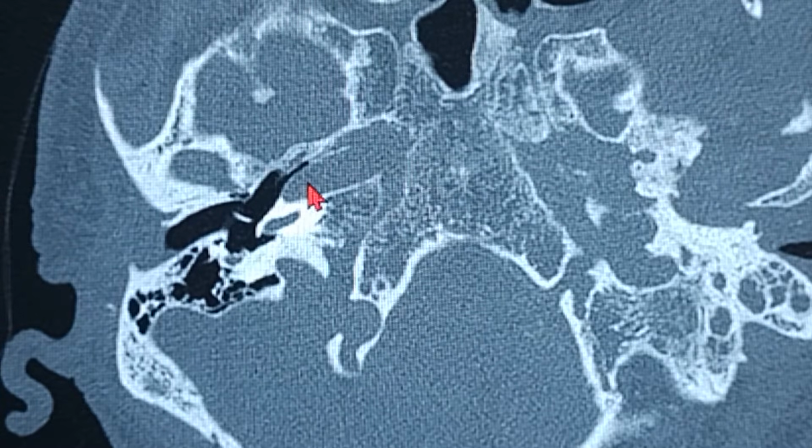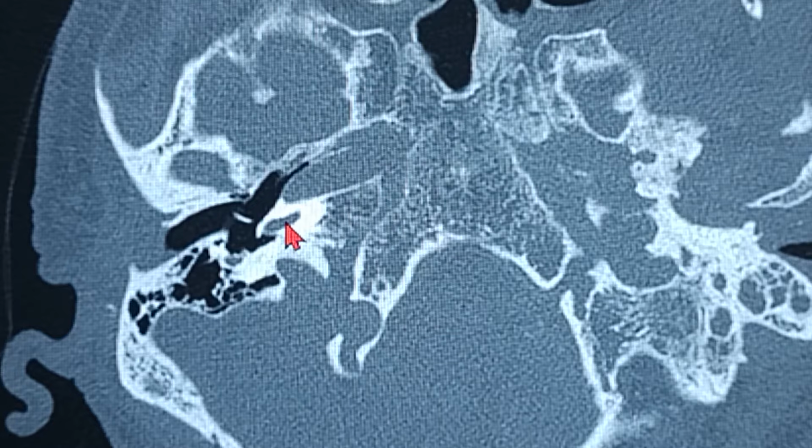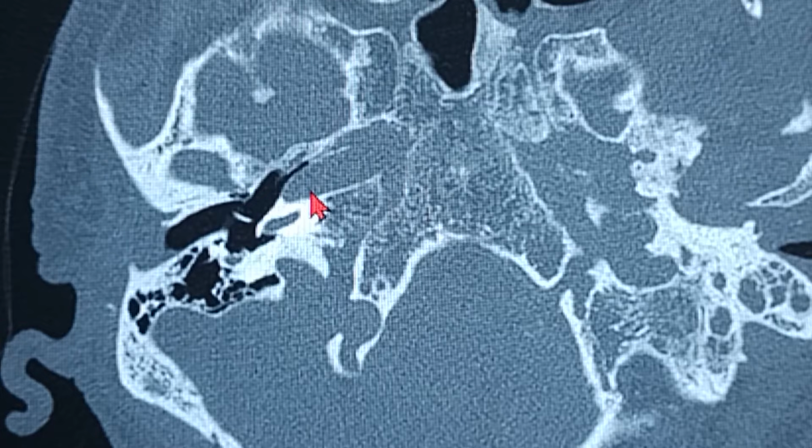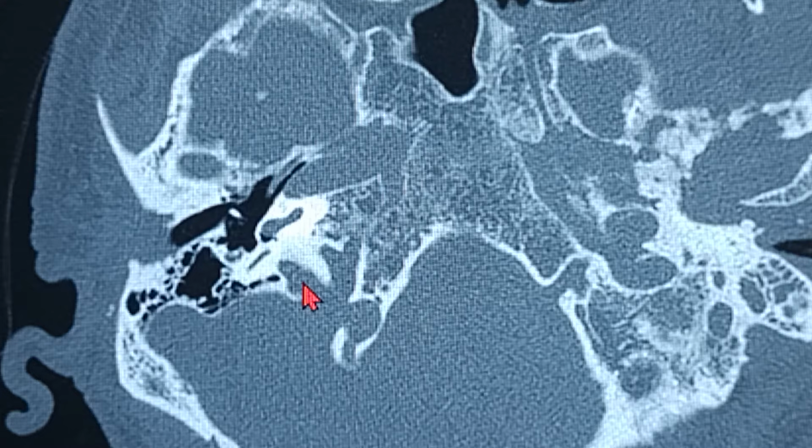So keeping the ICA as the landmark, the course of the ICA we studied right now, this is the promontory, that's the cochlea. The moment we see the basal turn of the cochlea, you see this is the round window, and that's the round window niche. That's the bony projection which covers up the round window opening. So this is basically the ICA, the cochlea, the basal turn, and the round window over here. Now this is the IJV, that's the jugular bulb, that's the jugular fossa. You can keep on following that.